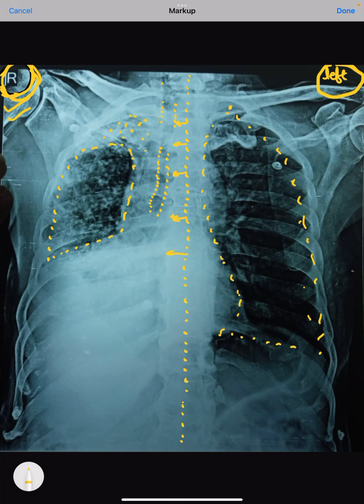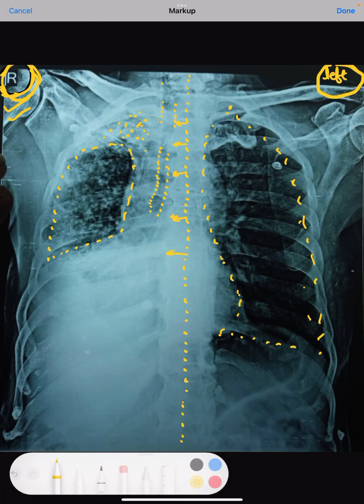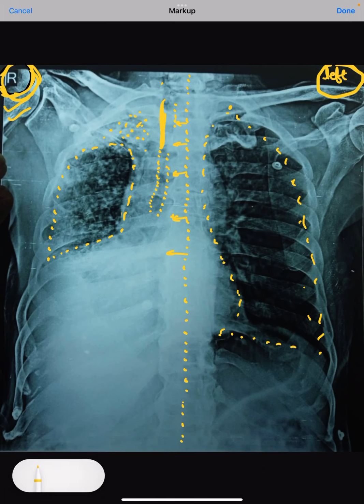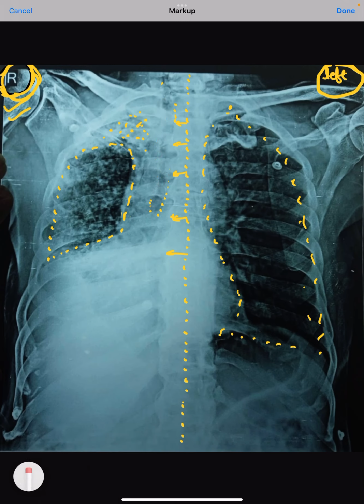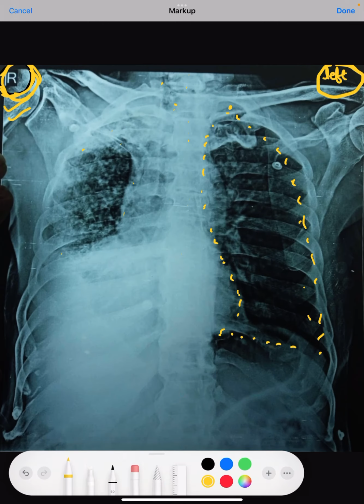Because the fibrosis is there, fibrosis will simply pull up all the structures whichever are present on the contralateral side. The other things which we can see in this fibrosis are, there are two more things which we can really make out very, very clearly in this structure.